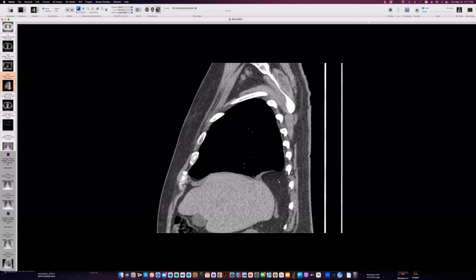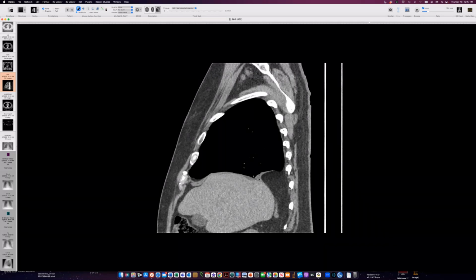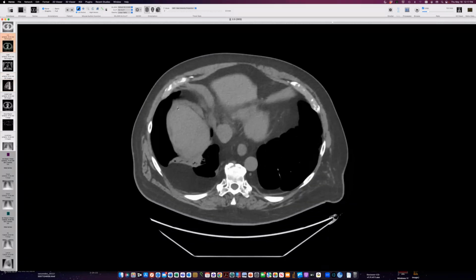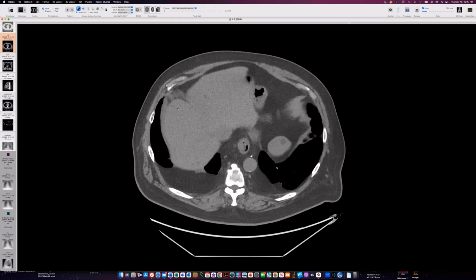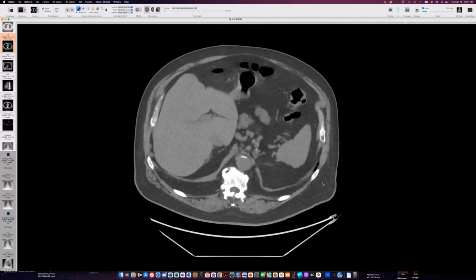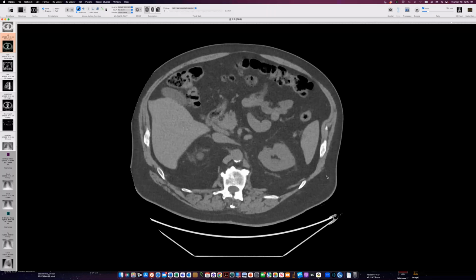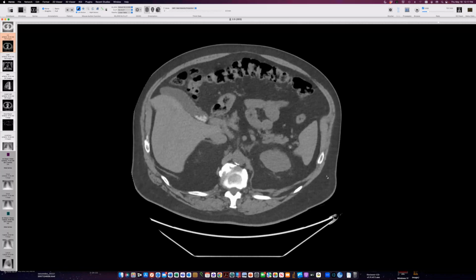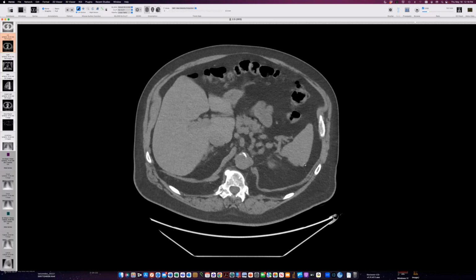Let's just go back to this cross section here because I'd like to make some points about Bochdalek hernia. Any posterior hernia is going to be called a Bochdalek hernia. But the classical Bochdalek hernia was what you see in infants. When an infant comes in with a congenital diaphragmatic hernia, it's usually on the left. It usually arises posterolateral. There's a foramen of Bochdalek back there. It's one of these places where the different components of the diaphragm don't fuse that well embryologically, and it leaves a weak area. So that foramen of Bochdalek is the source of the classic Bochdalek hernia. It's posterolateral, sort of out here.